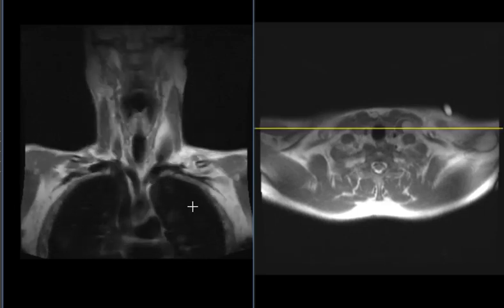We see the right lung, left lung. This is the chest wall and ribs. And here's the neck to get oriented. Here's the base of the left neck and left shoulder. And this is a marker over the area where he's having pain over the left clavicle. This is the midline. Here's the left chest. Here's the back, and here's the front to get oriented on this view.